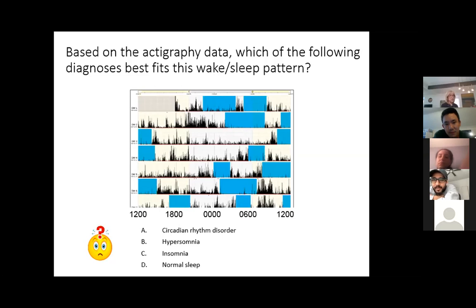Definitely not a hypersomnia. It doesn't seem like a good amount of sleep time. Normal sleep, it doesn't fit any rhyme or reason to be called normal sleep. You're out. I think this person has sleep onset as well as sleep maintenance insomnia.